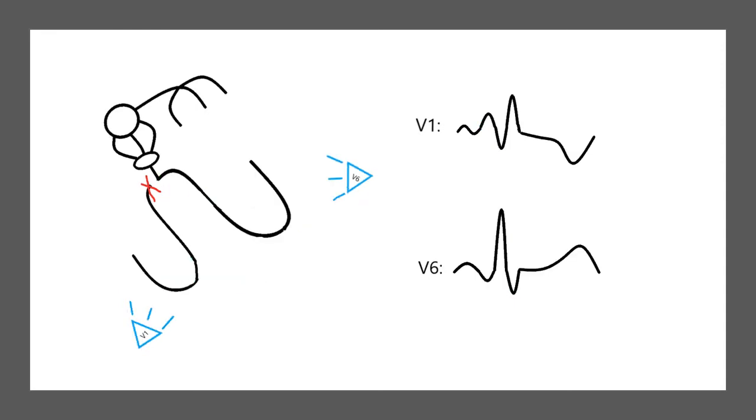Okay, and there's the morphologies you'll see. Now, anytime you have an aberrantly conducted depolarization, you typically run the risk of developing flipped T waves. So always look for discordant T waves or flipped T waves. They don't have to occur in every lead, but it is very common when you have an abnormal depolarization, you predispose that ECG to having flipped T waves.